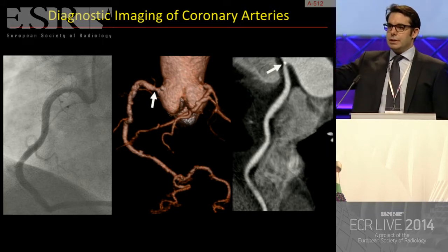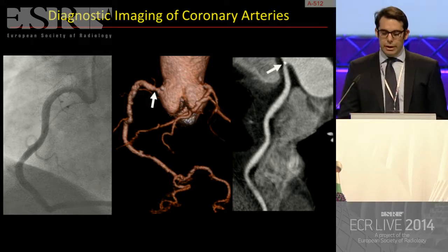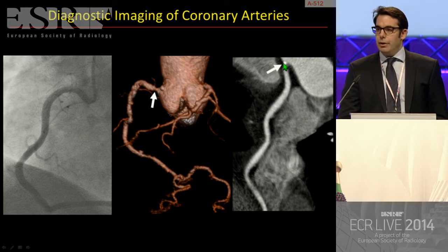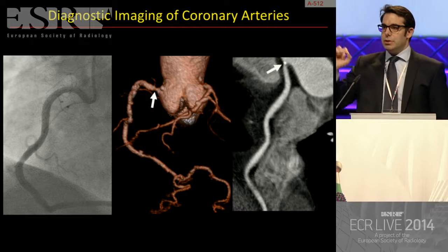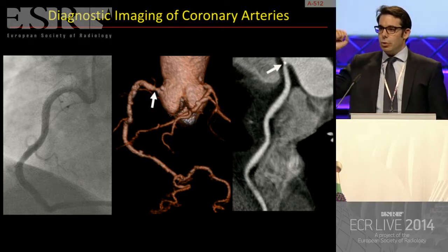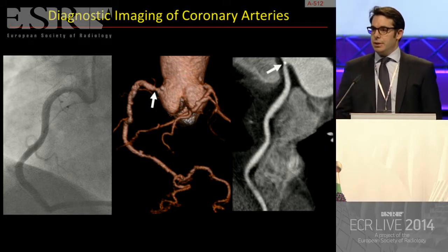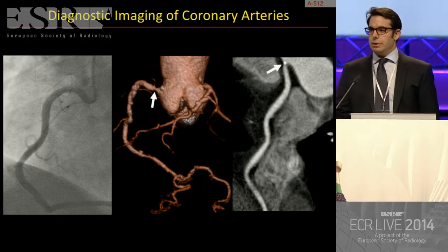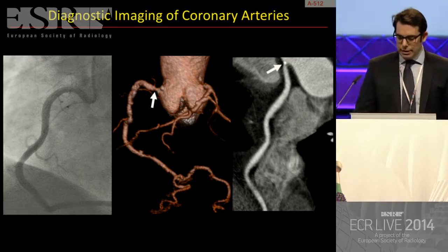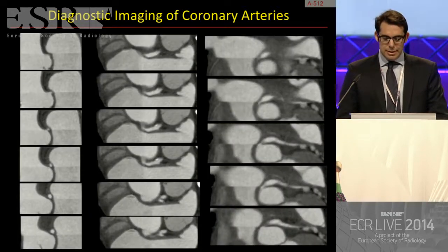So what can happen is that the person who's doing the cath can put the catheter too far into the ostium, so he can easily miss a stenosis at the origin. This is one thing. And the second thing is that if we see a stenosis, we have to say it, because if it's too tight, they put a catheter and they can temporarily occlude the vessel. So when we report this, first, look at the ostium, because they can miss the lesions. Second, be aware of what can happen, and you have to tell the cath lab person that there is a significant stenosis.